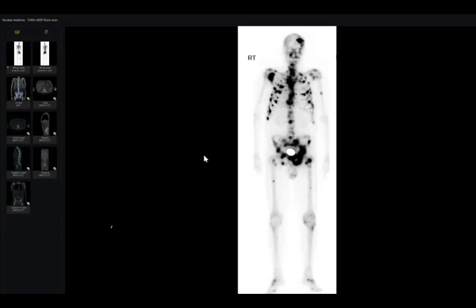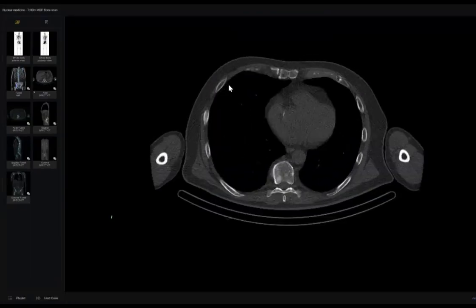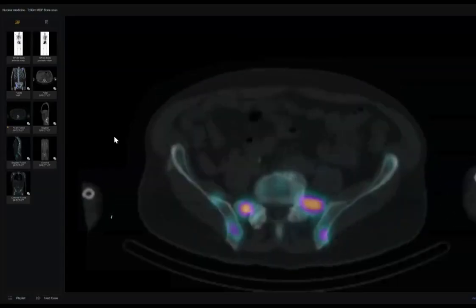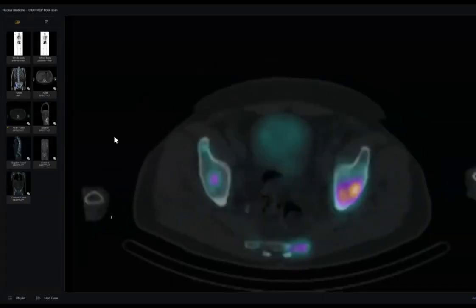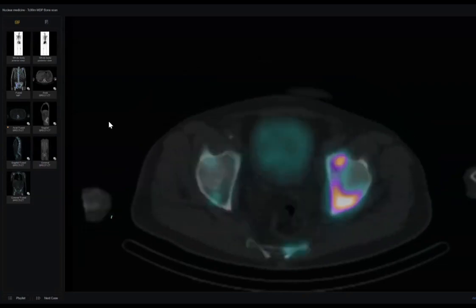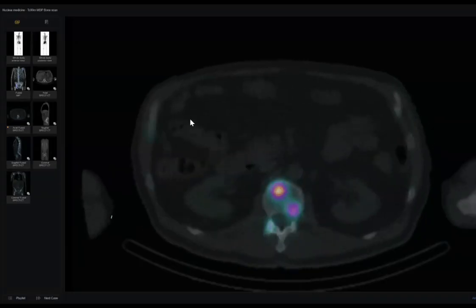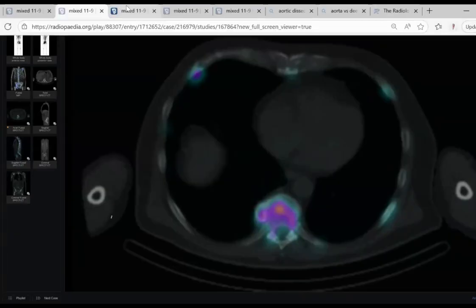Number two, even to discover the prostate cancer itself, because it will bind and attach to the prostate cancer. Why? Because it is very specific. This is SPECT, by the way, and all of us know SPECT is a fusion between nuclear and CT. This gives us information about the anatomical details of the patient.